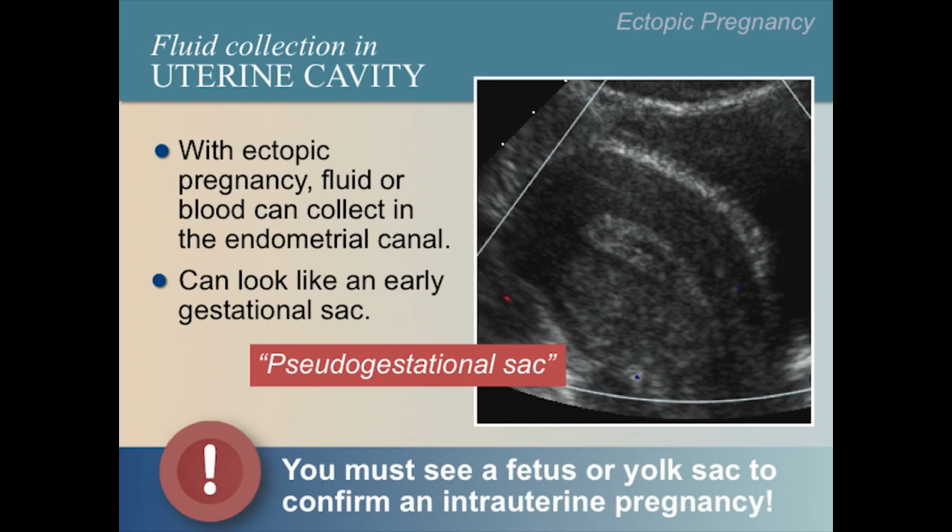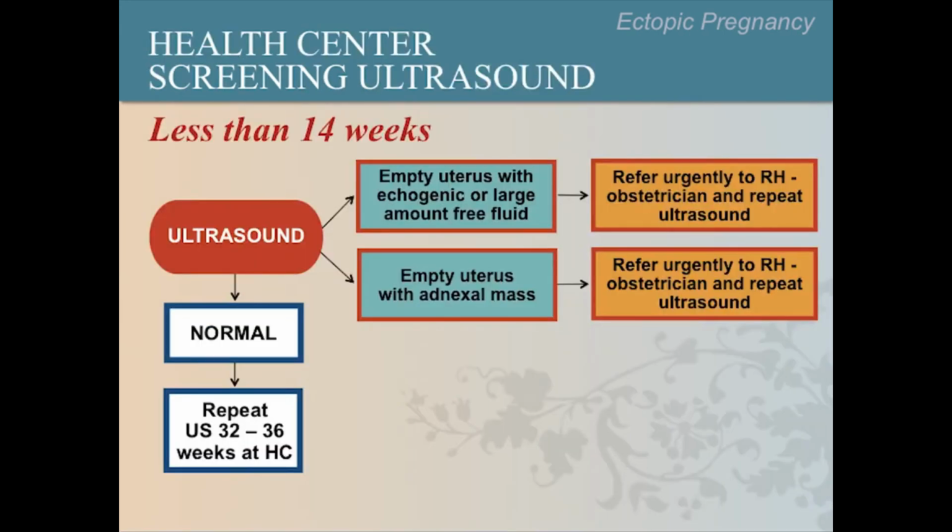pregnancy. If you do not see a gestational sac, but see echogenic or a large amount of free fluid, or an empty uterus with an adnexal mass, refer the patient urgently to the referral hospital. This may be due to an ectopic pregnancy, which is an emergency.